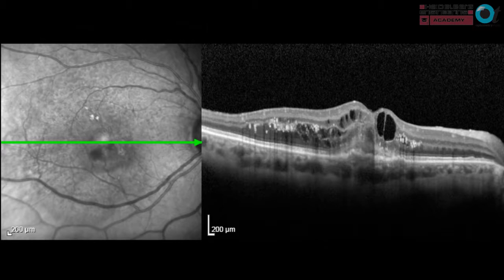If we examine anterior to the RPE, the most striking feature that we can see is the large hyporeflective voids within the OCT cross-section, which are confined to the inner nuclear and outer nuclear layers of the retina. We can see some highly reflective structures within the OCT cross-section, which is likely to be consistent with exudate. So one might be thinking that we're looking at retinovascular disease.